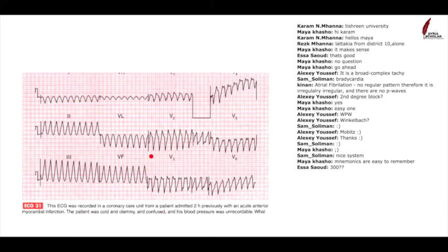And that's often, if the patient's heart isn't beating, it can go into this. Sometimes people can have a heart beating with this sort of tachycardia, but often it can be somebody who's had a cardiac arrest, so their heart has stopped beating because it's far too quick, the electricity that's going through it. It's good to just be able to recognize this broad, complex tachycardia.